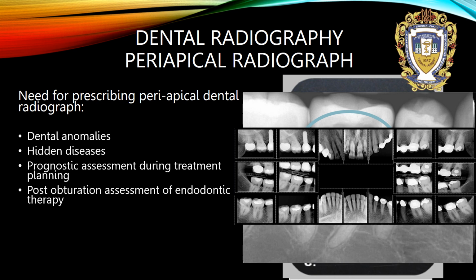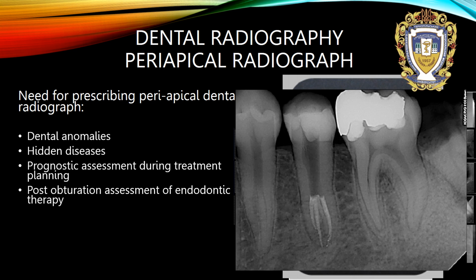Post-obturation assessment of endodontic therapy. Here is shown a very interesting situation. Left lower second premolar with successfully filled 1, 2, 3, 4, 5, 6 root canals.